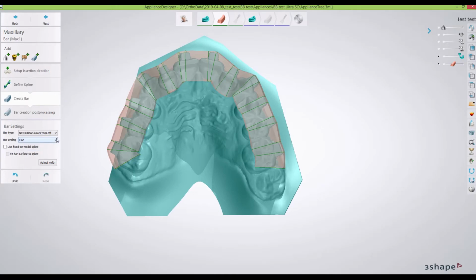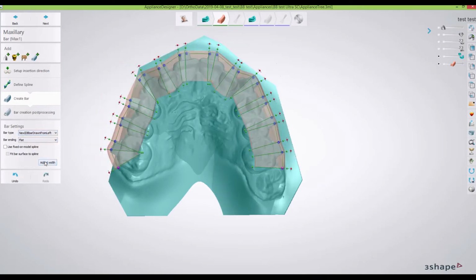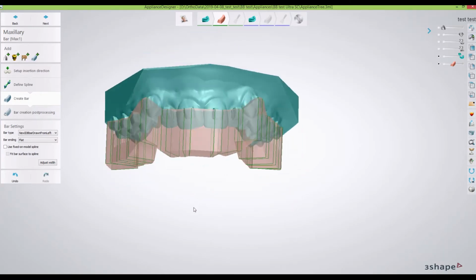For some reason, if you drew from the opposite direction, say if you happen to see something like this, don't panic even though you want to. What happens is you drew your points from one side and you had your bars set up to draw from the other, and that's something you'll set up in the control panel. So if you happen to see that, don't freak out. Just go down and tell it, yep, no, that's the direction I went, and you'll see it center itself.